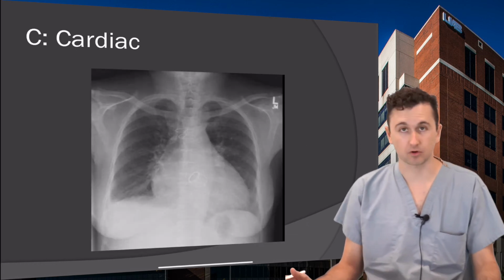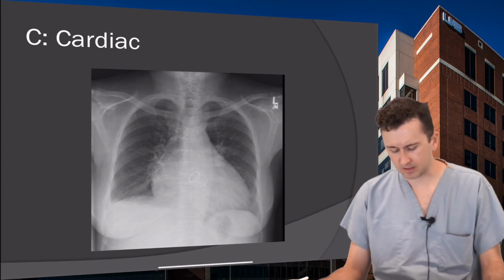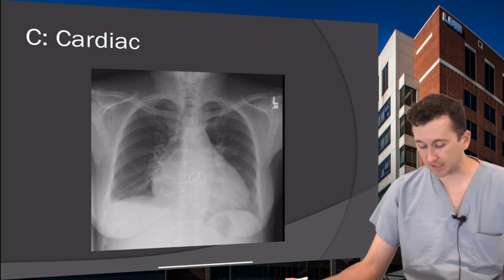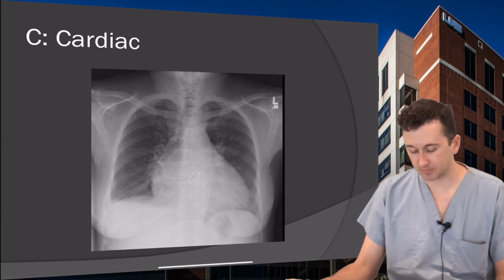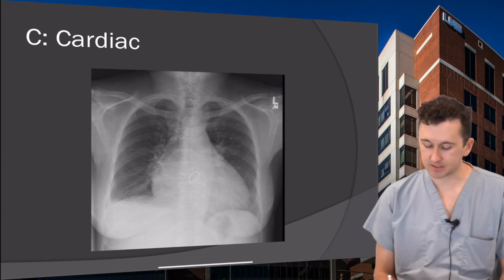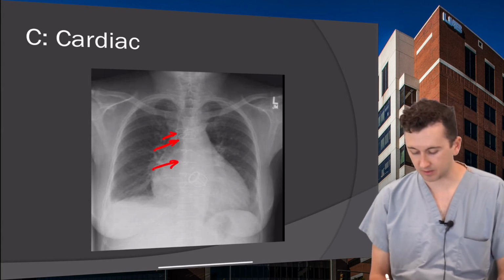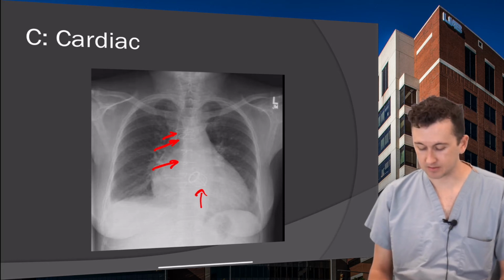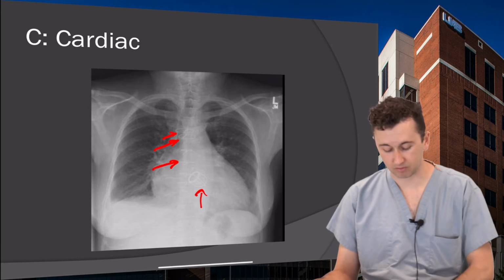C stands for cardiac. Okay, so I like this image because this is where I usually ask you guys what kind of surgery you think this patient has had. But you can see several sternotomy wires here, okay? And this patient also has a mechanical mitral valve. So this is a patient who's had an open mechanical valve replacement.